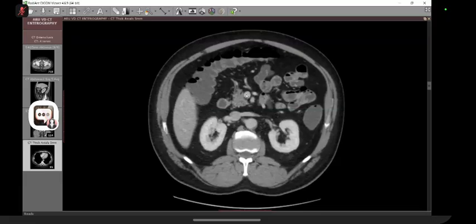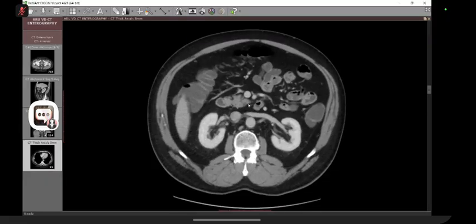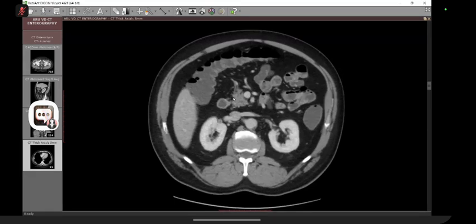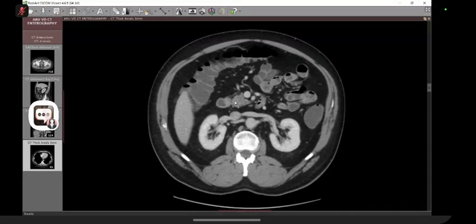I'll tell you the pancreatic anatomy in great detail when we reach that point. But this is the superior mesenteric vein. It should be etched in your memory as a landmark for you. Superior mesenteric vein is this, and this feathery appearance organ is the pancreas. Portion of the pancreas which is posterior to the superior mesenteric vein, this one. What is this? Excellent. This is the uncinate process. So on the right side is the head of pancreas. And this head of pancreas is related to D2.